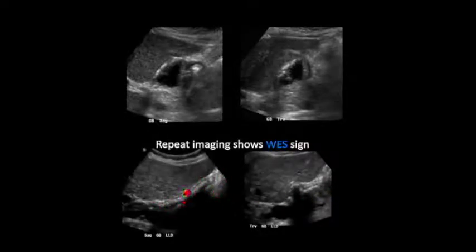Now, this is a gallbladder that's so filled with stones and shadowing that you don't see much bile in there. So it is a WES sign. And that's the problem. When the gallbladder is so abnormal in appearance that it's not appreciated initially by the person imaging, they'll pick out something else. So what did they pick out here to label gallbladder? That was the duodenum.